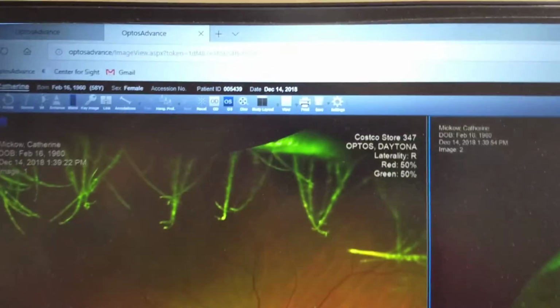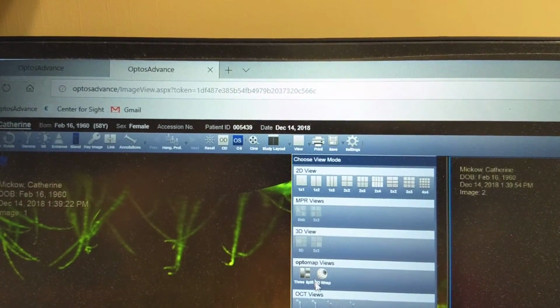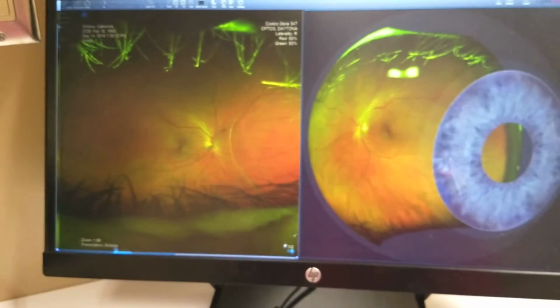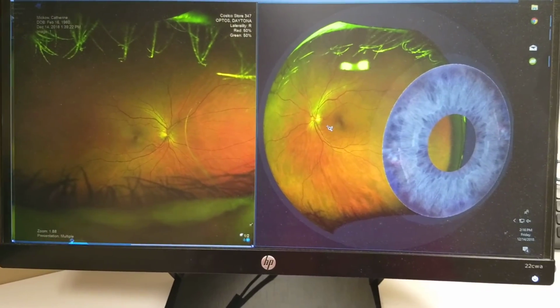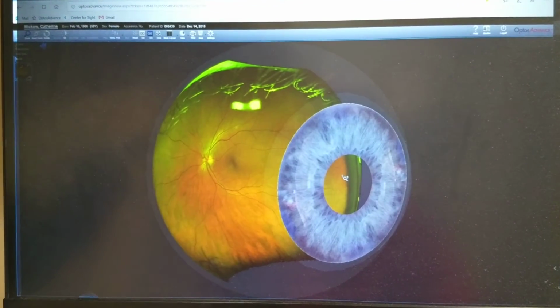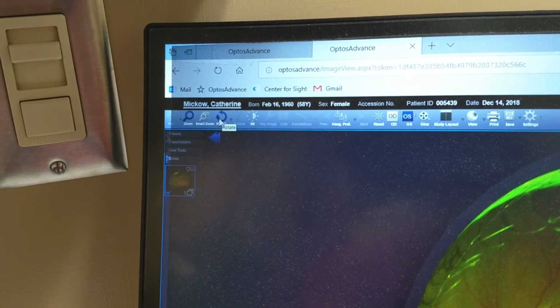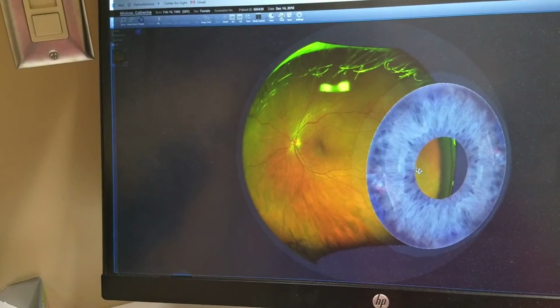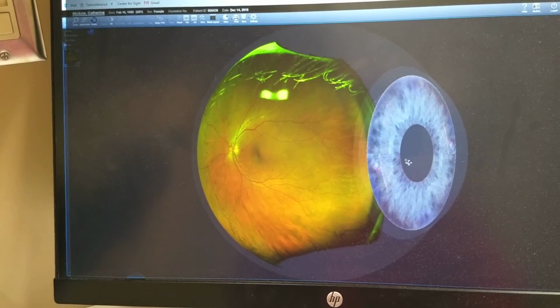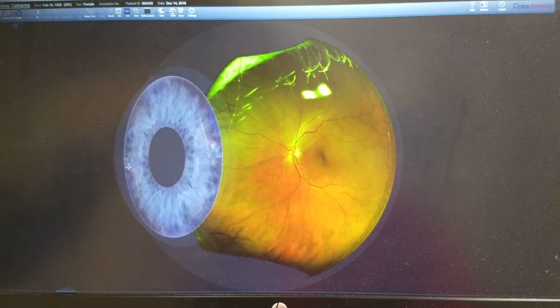What it does is you have to go to this icon that says View. You go down to 3D Warp here, and it will only do one at a time until you double click it. Now I double click it and it lets it take over the screen. Now to rotate it, you have to come back over to here and click on rotate, and then you hold the left button, and then you can rotate it around to give them perspective. It's a little more intensive, unfortunately. It gets the job done.